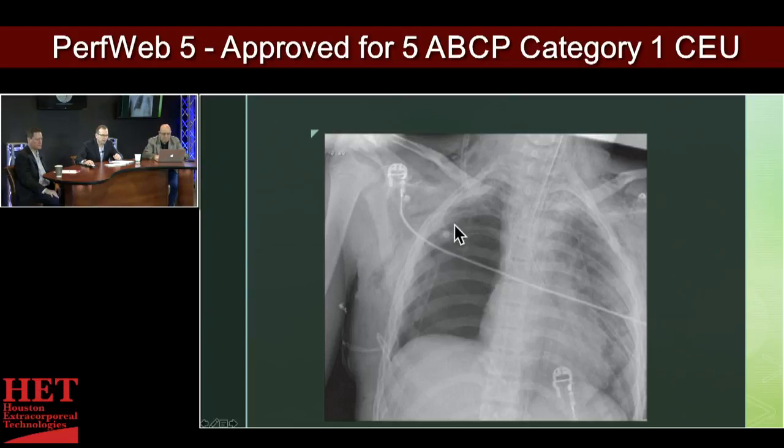This one is very, very dark. This one is very, very white. So there's something going on preferentially between the left and the right lungs. Which one is normal? Which one is abnormal? Are they both abnormal? And if so, in what way? You can look at the endotracheal tube as it comes down the midline. And this patient, you could tell, is a little bit rotated.